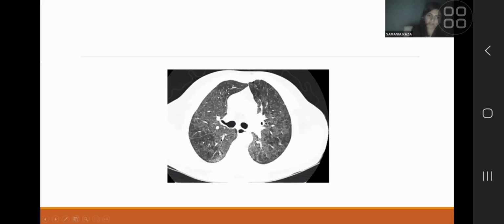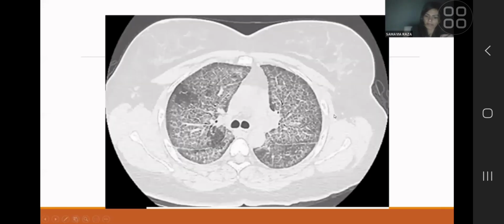So you have centrilobular nodularity on the left, you have mosaicism, you have ground glass. So those terminologies you put on a piece of paper. Yes, exactly. So you have hypersensitivity pneumonitis. Very good. And I think this is the last one.